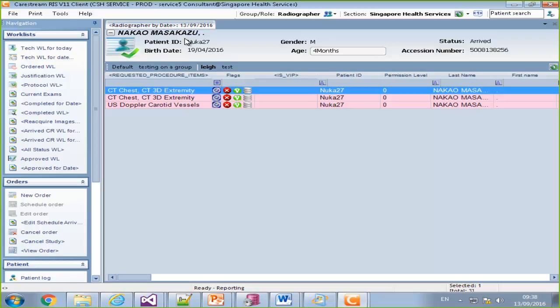This feature allows us to select a couple of studies and open them in the same form. In this way, we have only one form to handle, and the data will be copied by some rules that Talor is going to explain later. So that's it in big picture.